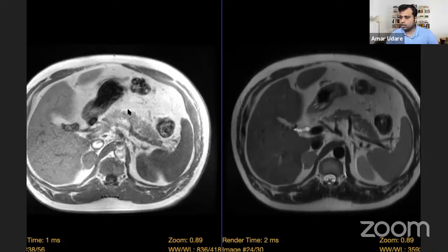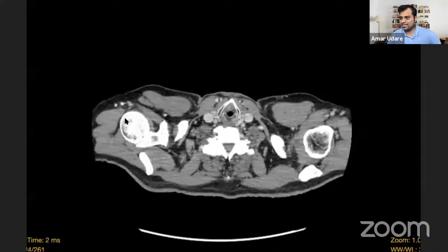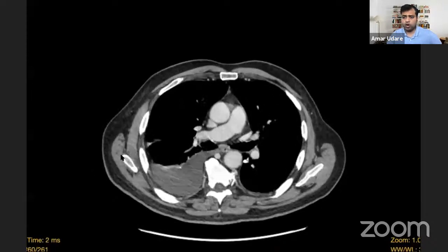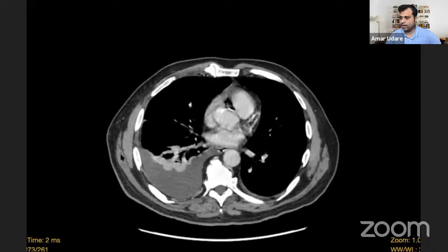So that was about adrenal adenoma. Let's move on to the last case of the day. Okay, so this is an interesting case. I'll go over the images, and this is more of a regular routine case rather than a typical exam case.